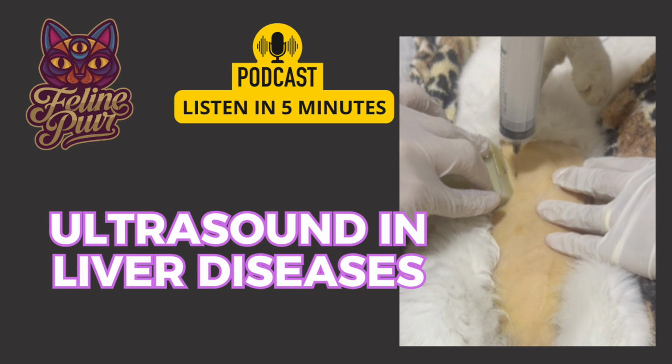Cholangitis, inflammation of the bile ducts, is a common disease in cats. On ultrasound, cholangitis may manifest as thickening and irregularity of the gallbladder wall, presence of gallstones (cholelithiasis), and/or biliary obstruction. Dilation of the intrahepatic ducts, visualized as anechoic tubular structures in the hepatic parenchyma, is a reliable sign of complete biliary obstruction, although it takes about 5 days to develop.